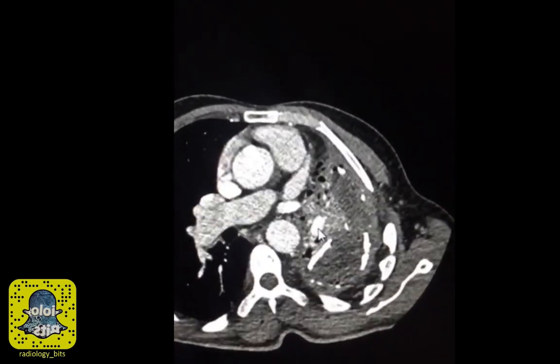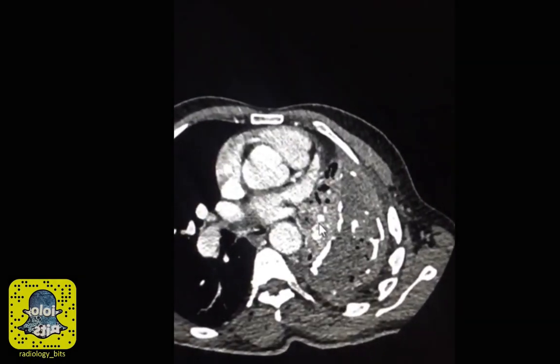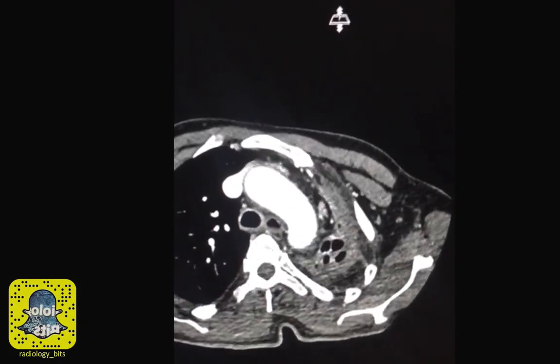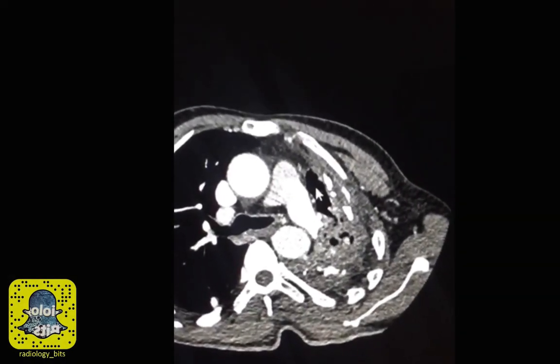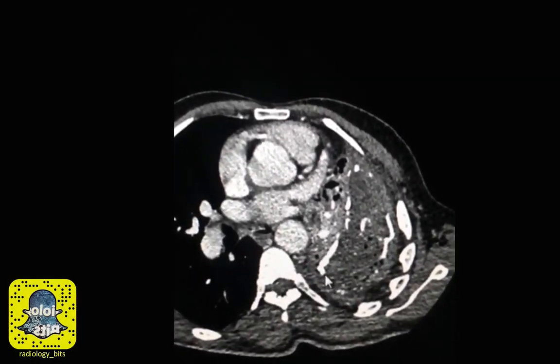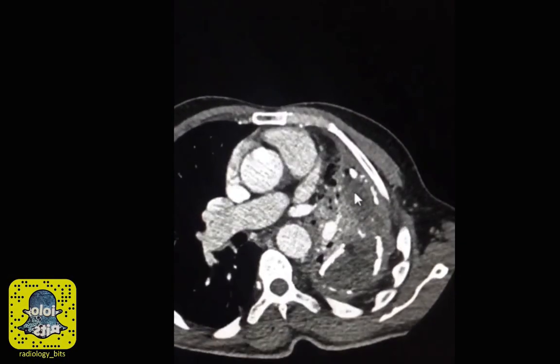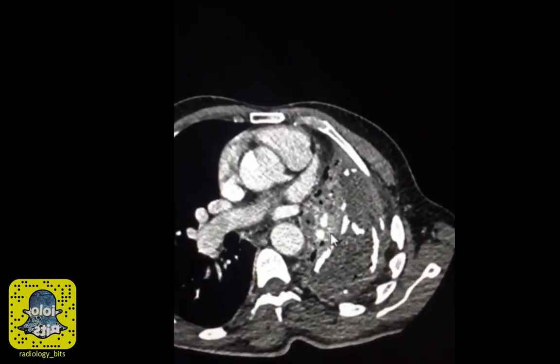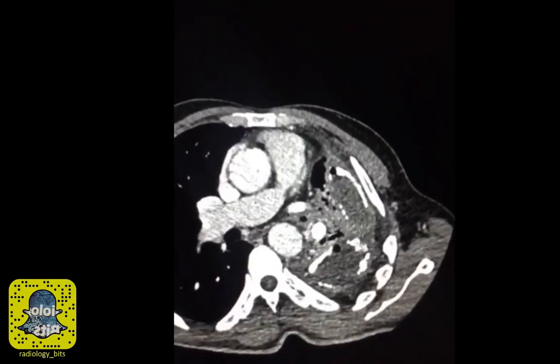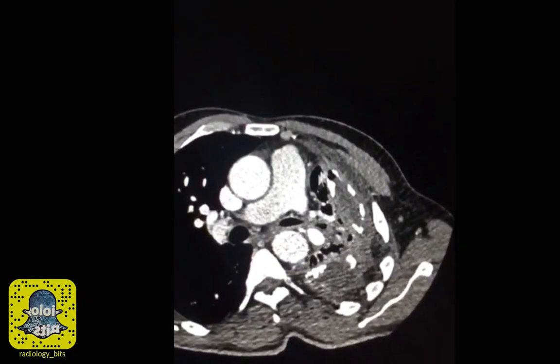The heterogeneous appearance here is actually the compressed, diseased, and distorted lung. Look at how the lung is distorted at the apex here. There is some aeration anteriorly. Now, such a diseased pleura that's relatively thick and calcific with adjacent lung distortion is consistent with what's called a calcific fibrothorax. So you have pleural thickening and calcification, lung distortion, associated fibrotic changes, and volume loss.